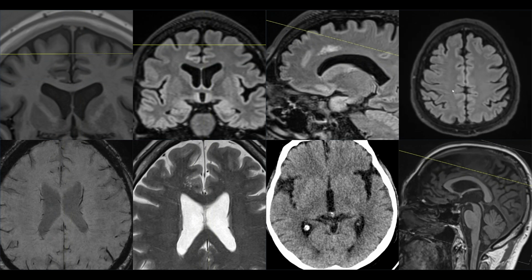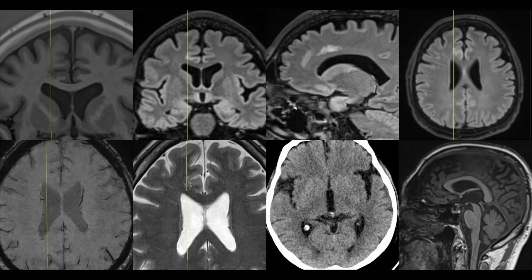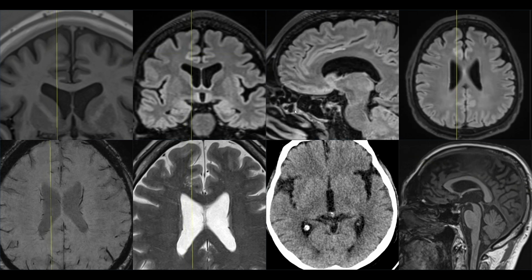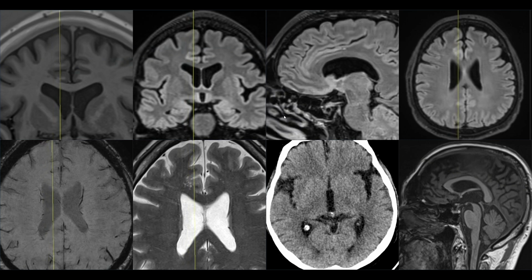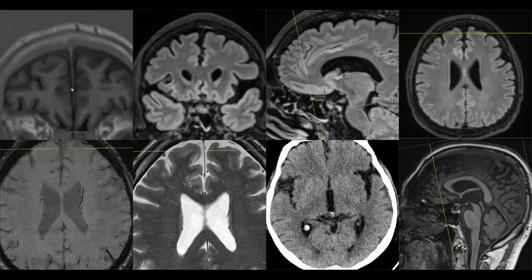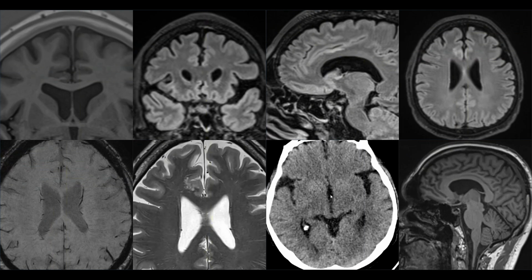and this all looks to us as MVNT, that is multinodular and vacuolating neuronal tumor, the type of a low-grade tumor that is highly associated with epilepsy, but otherwise an incidental leave-me-alone finding.